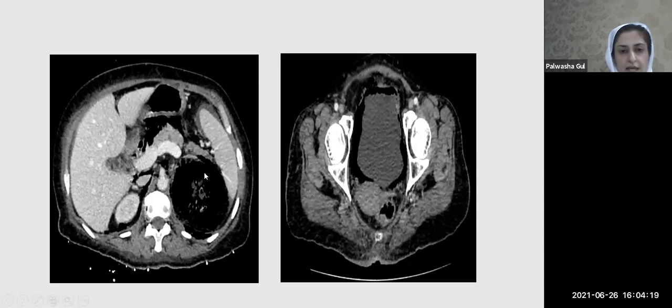So the perirenal space is connected to the contralateral side, just anterior to the aorta and the inferior vena cava, and that's why we can see air anterior to the aorta and inferior vena cava. And we can also see some amount of free air sitting in the right perinephric space as well. And this has gone across the midline to the right side.